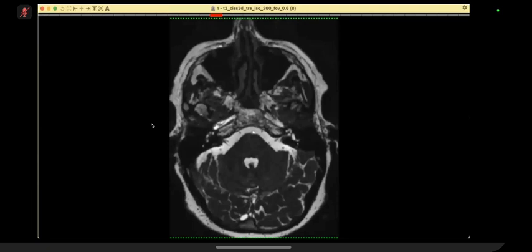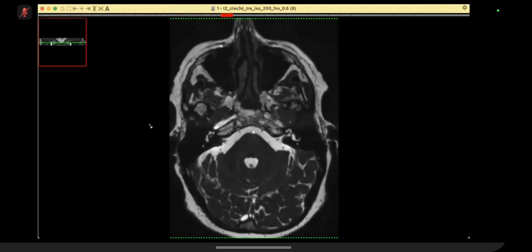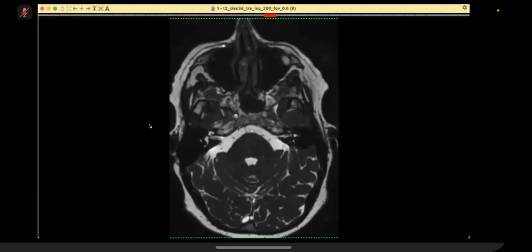But here, what sequence is this? Can you ask for the mouse? Sure, doctor. I think I already have the mouse, doctor. If you're unable to scroll, I'll take over. I'll help you.